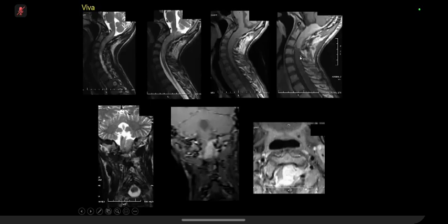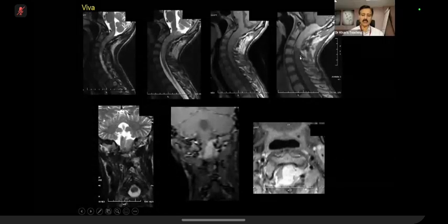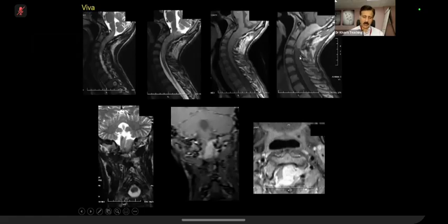In this case, given that it's going over at least two vertebral bodies, I wonder, could this be a meningioma? Absolutely, this is a meningioma. You see the intradural extramedullary lesions, two are the king, just like intramedullary tumors, where the two most common tumors were ependymoma and astrocytoma, and at times hemangioblastoma. As far as intradural extramedullary, the king tumors are meningioma versus neurofibroma or schwannoma. So this one is a meningioma, and which enhances like anything.